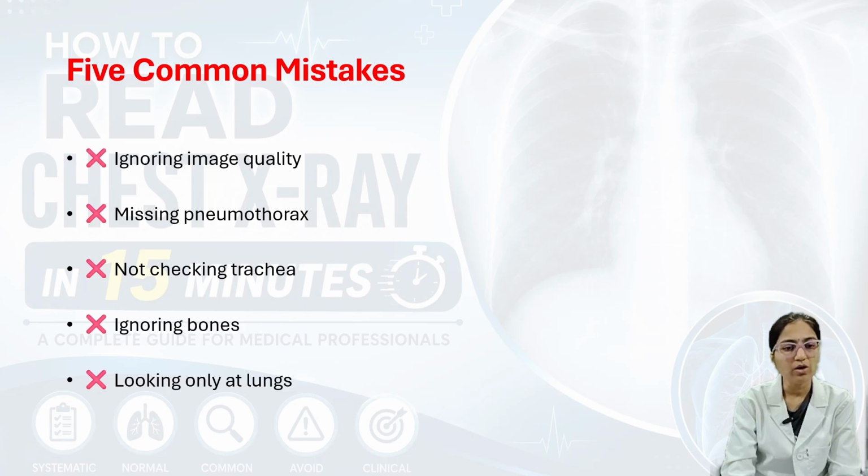Next, 5 common mistakes everyone makes. Ignoring image quality, missing pneumothorax, not checking the trachea, ignoring bones, and looking only at lungs.